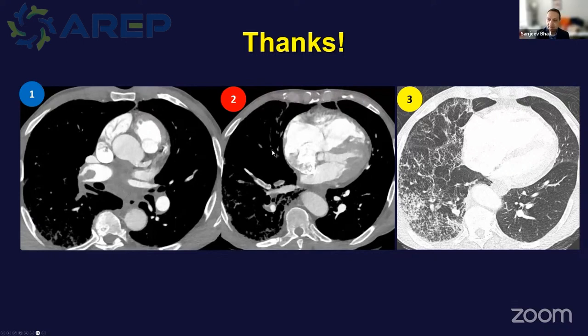I just want to share with you again that when you are thinking about acute pulmonary emboli, it's really useful to have this 1, 2, 3 approach. Make sure that you're looking at the filling defects to see if they are central or peripheral. If they're expansile, they're much more typical of acute pulmonary emboli. But you also want to see what's going on with the right heart. You can see here, for example, there's bowing of the ventricular septum. There's not right ventricular hypertrophy. So now this gives us an idea of what's going on. And then you can see that there are some changes in the lung.